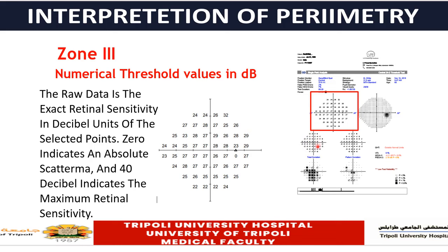That's the total deviation plot. Now, this is the numerical plot.